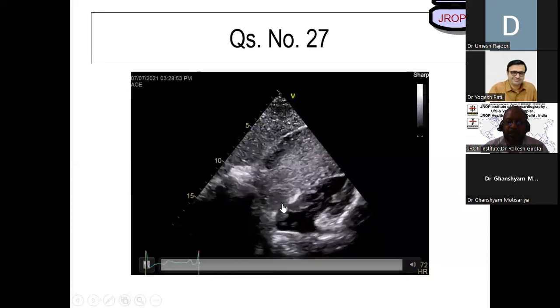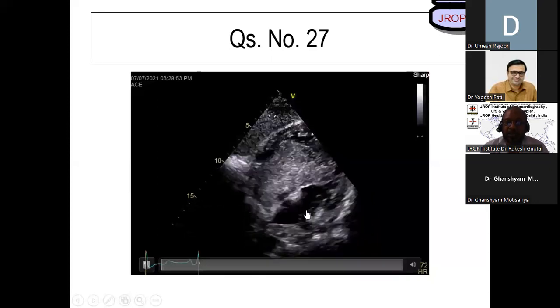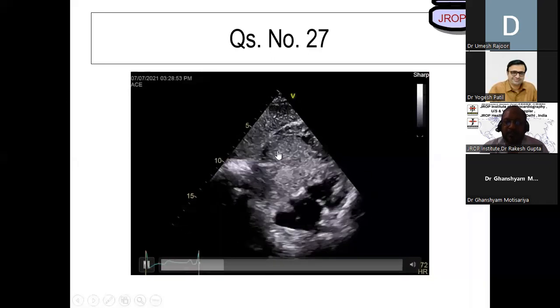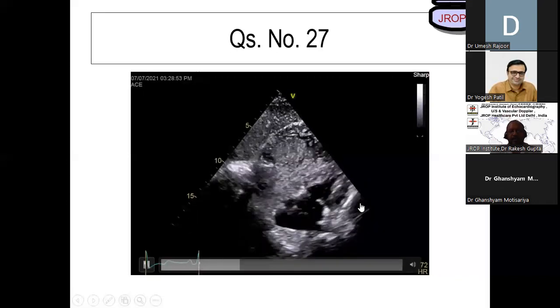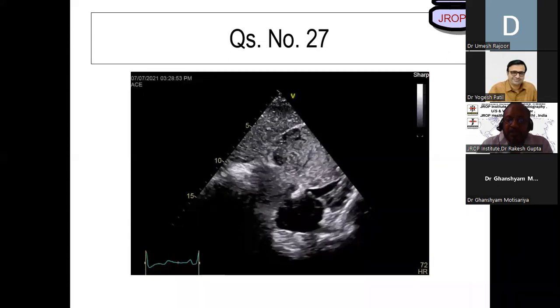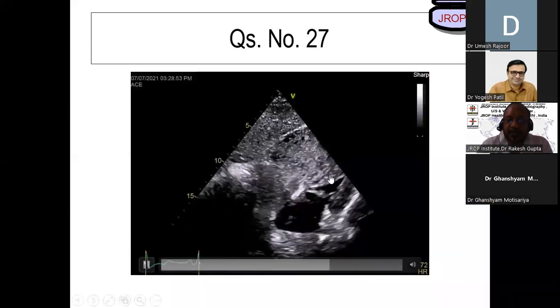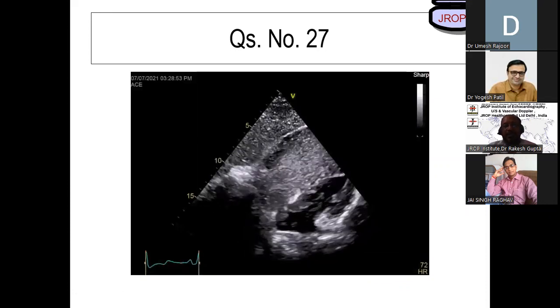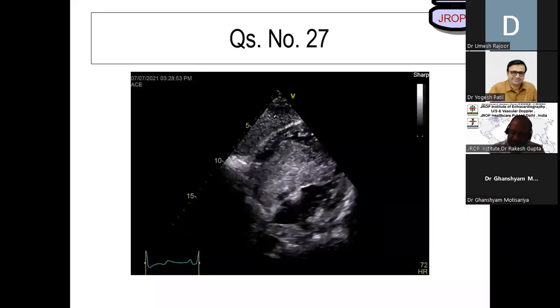He did not talk about contrast saline, and you could see some bubbles coming into the left atrium. But one more finding in this particular image: dilated RV and RA. Look very carefully. LV is hypertrophic. This patient had significant coarctation of aorta associated with it, and the catch point was thickened LV.